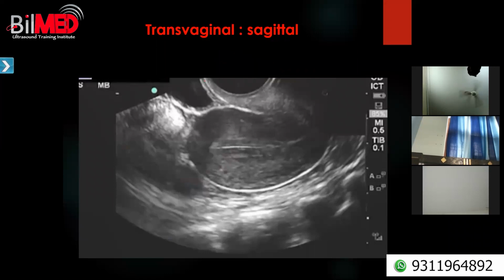Why do you see this footprint on the top? By top, I mean over here. It is not over here, it is not in the bottom, and not sidewise. Right or wrong? So this footprint is on the top of the image.